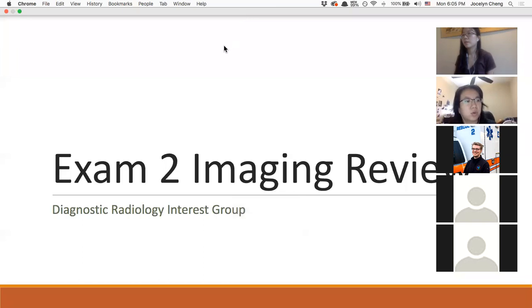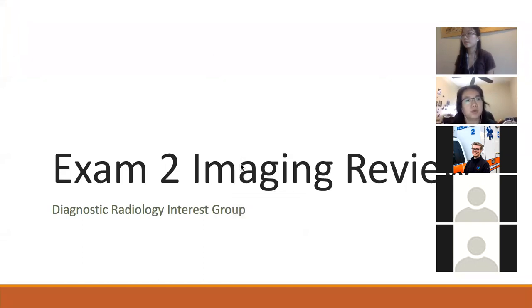get started. So we're just going to go through a quick imaging review, specifically looking at the X-ray and CT images that will be on the exam. It's high yield in the sense that there's always a couple of the images on the exam, which means that they're pretty easy points, as long as you're familiar with the images. And that's what we're going to try to help you guys out with. Jocelyn, can you go ahead and click to the next slide?